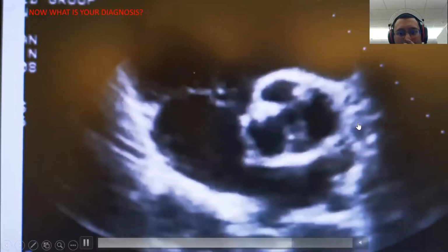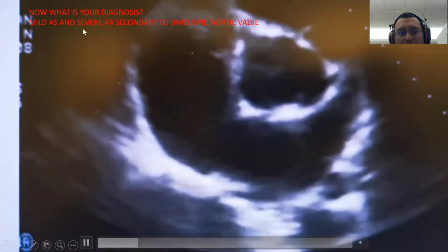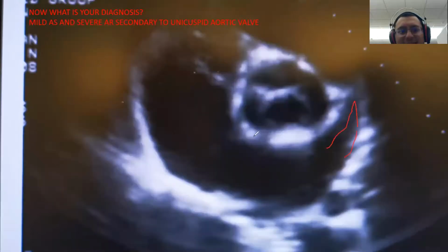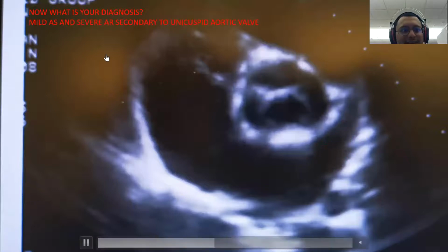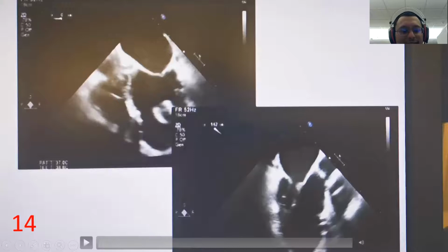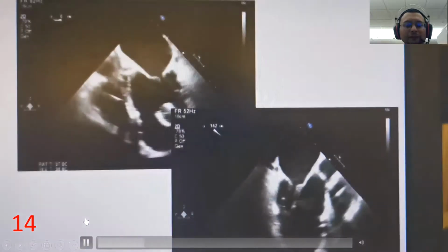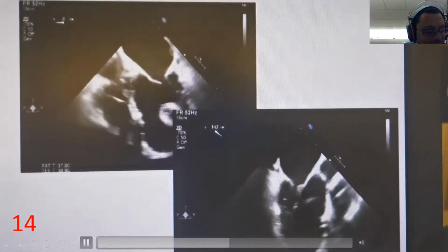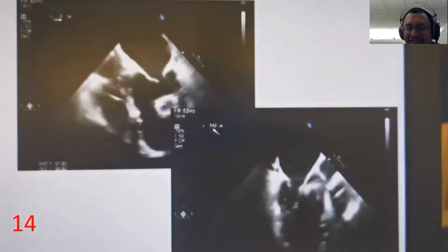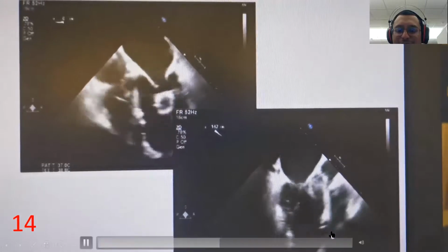Okay, good. Where exactly is it? This one. Everyone has to point it out. This one. Okay. Right. Okay, what about this one? This is quite easy. A ball. This is a thrombus. Does a thrombus look like this? Okay, maybe thrombus.